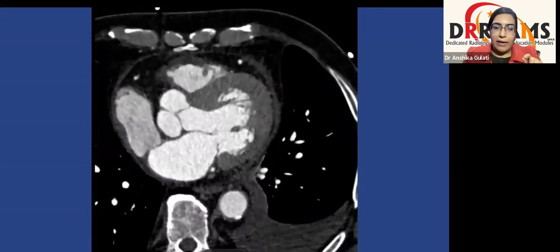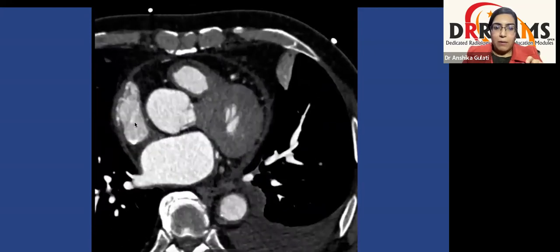atrium. Now, how do we identify the morphological right atrium? You see, it is the right atrial appendage, which is broad based and triangular in shape, and there are multiple filling defects within the right atrial appendage. These are the pectinate muscles, and if you can make out, this is the crista terminalis, which is the junction between the right atrium main cavity and the right atrial appendage. This is a muscular ridge projecting into the lumen at the junction between right atrium and its appendage, and it causes a depression on the outer surface of the heart, which is known as sulcus terminalis.